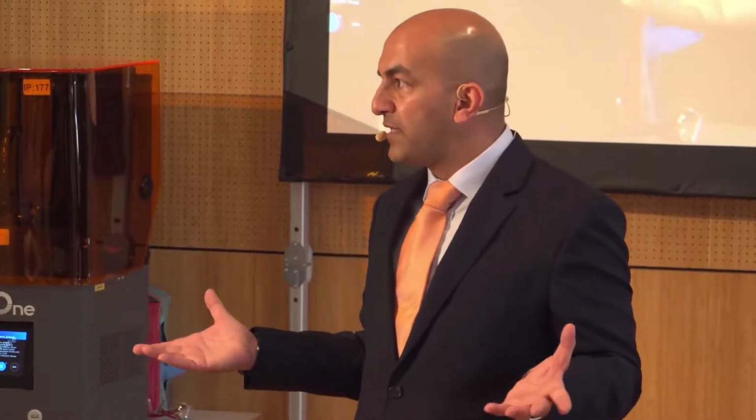Obviously, after that, there's some finishing and there's some curing time. Would you say about an hour, and you get some finished guides? But the most time is waiting, because you waited for 25 minutes, and then the curing and the cleaning and the curing. What you said is very important, that you do that precisely. You have a medical device that you produce here, and you have MDR regulations in the future, so you have to stick to the instruction of use, and it will take maybe 20 minutes, 15 minutes after you get it out.